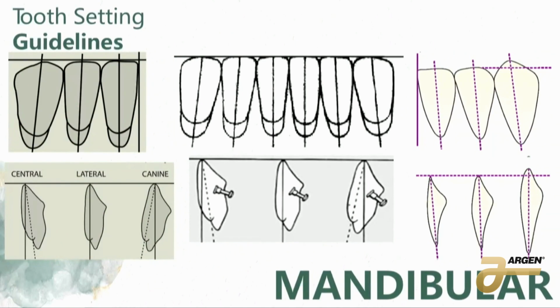Here's the lowers. Like I said, your teeth will kind of come preset for you. That is dependent on the manufacturer. So if you're using Ivoclar teeth, somebody from Ivoclar has gone into 3Shape or exocad and done a setup to what they believe is the perfect setup. If you're using Dentsply teeth, I don't know, Vita teeth, all the different libraries, somebody from that specific company has gone on and set up the teeth into an ideal setup. That doesn't necessarily mean that you can't make changes, but it is a much easier starting point from analog where we're slapping teeth in there one at a time, right? So it's okay to allow these new generation of technicians to have a little bit easier as long as we're explaining the why.